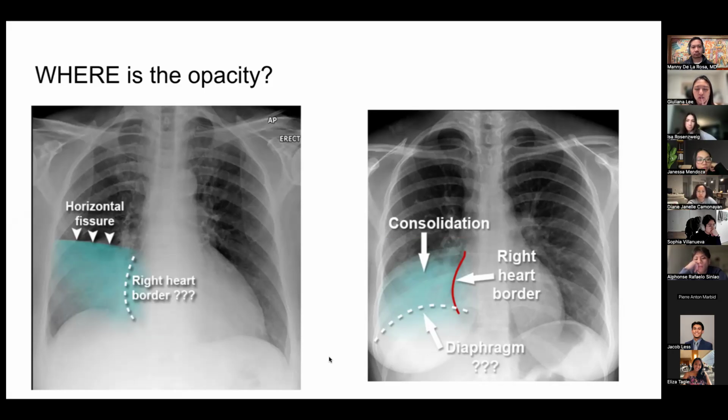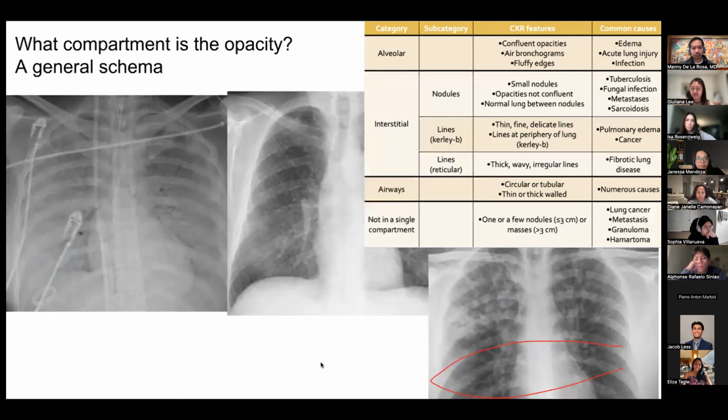And then I just want to call out really briefly on this chest x-ray, we see that this patient is someone who has breast tissue. So another thing that you should be able to notice on a chest x-ray. Next slide. Sorry, I have to take a cough break.